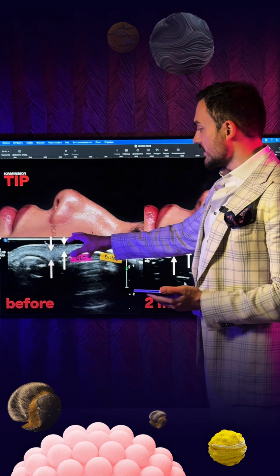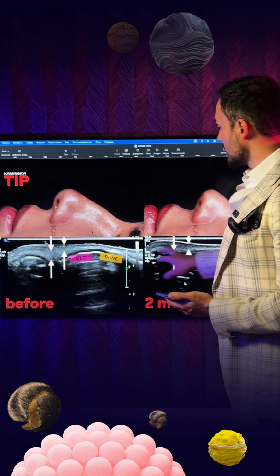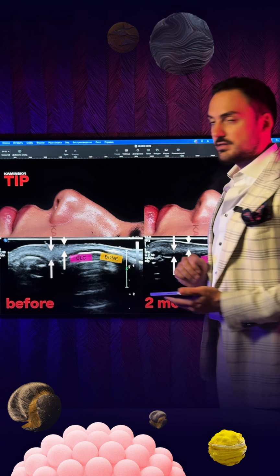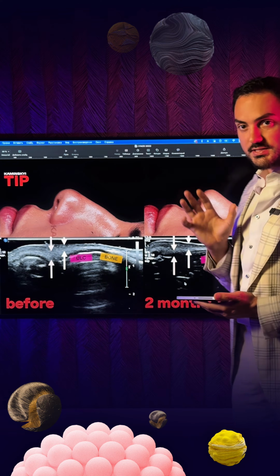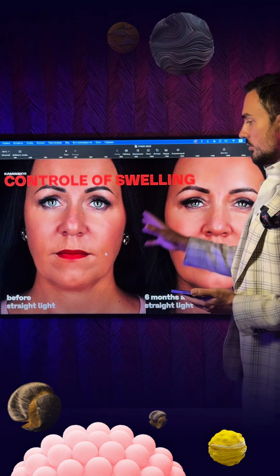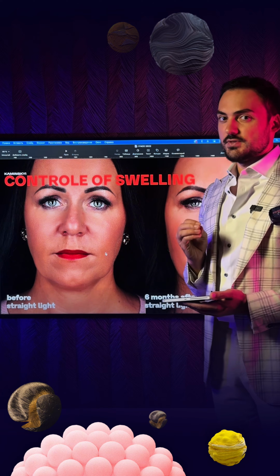We can analyze the thickness of the SMAS, we can analyze the thickness of the dermis, and we can analyze the position of the cartilages. And when we compare the before and after picture, we understand that after 2 months, in this case, we have the final result.